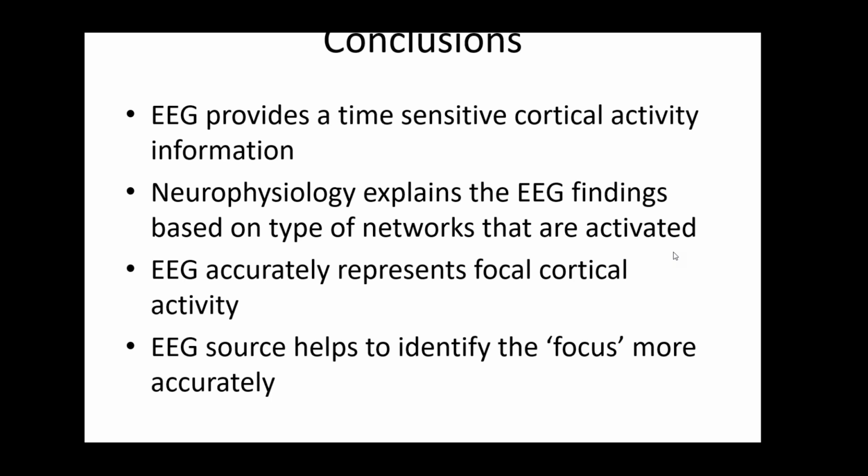You have to identify a spike that has a good signal to noise ratio and has no artifacts at the same time as the spike. So you'll be able to predict where it's coming from based on that.